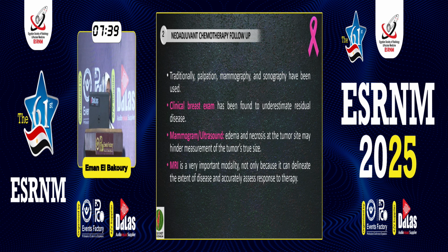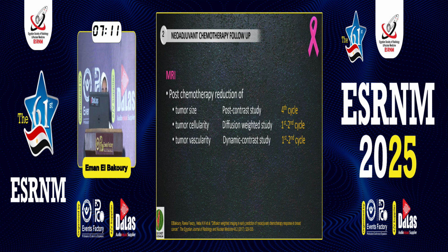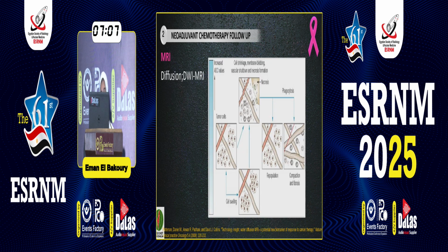So the mammogram and ultrasound, actually ultrasound is very well, however, it can be affected with the necrosis and the edema. Also, the finding may be not complete in the ultrasound. So the MRI actually is our gold standard. And in MRI, after neoadjuvant chemotherapy, if there is a response, you have a reduction of the tumor size as early as the 4th cycle, and the cellularity and vascularity as early as the 1st to 2nd cycle.